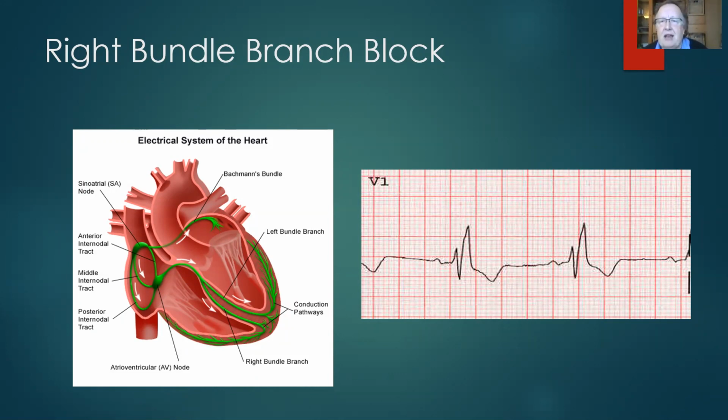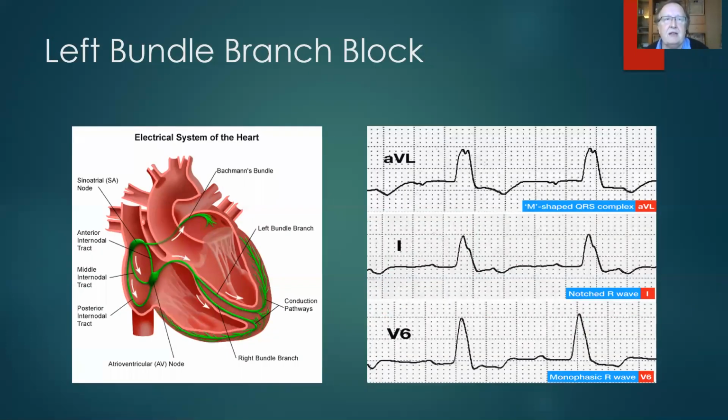And we can see there that the T wave is upside down. And that is because if ventricles contract abnormally, they relax abnormally. Now, sometimes this is called rabbit's ears, but we can see straight away that there is a notch. Patient may be able to tolerate this. It's interesting to know, but it's also worth knowing because we need to know on the next slide the difference. So we're moving on to the next slide, please.